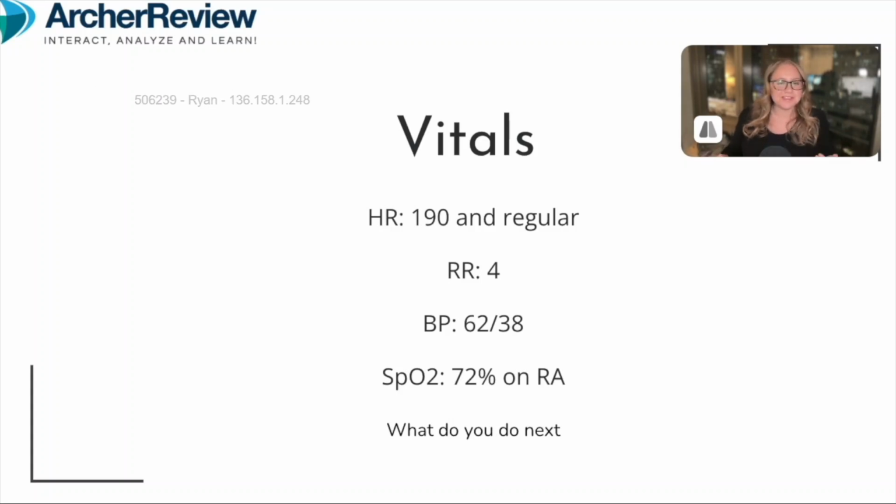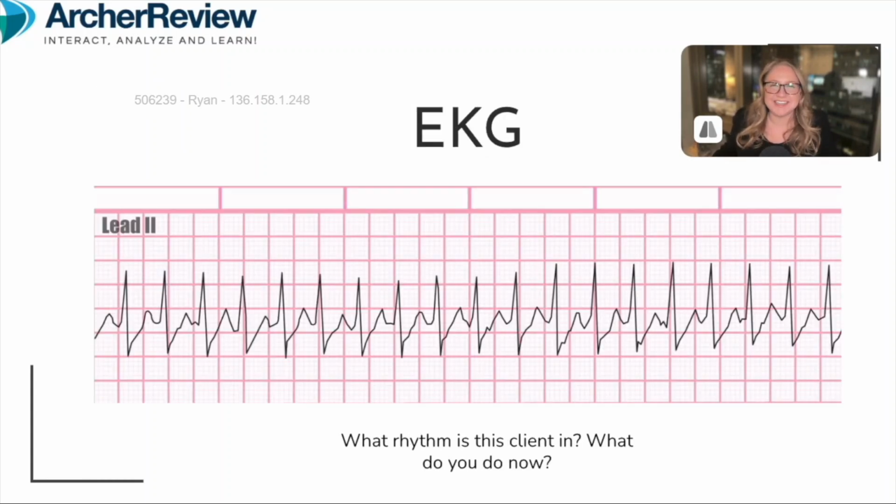All right, so pause again. What are you going to do next with this information? Did you say get a 12-lead EKG? I hope so. We need to figure out what type of tachycardia this client is experiencing. Is it sinus tachycardia, supraventricular tachycardia, ventricular tachycardia? We have different interventions depending on what's going on. Because this client's heart rate was greater than 180 and it was regular, I'm worried about SVT.